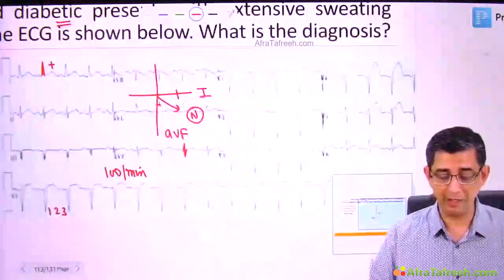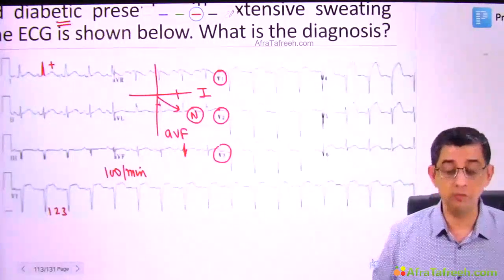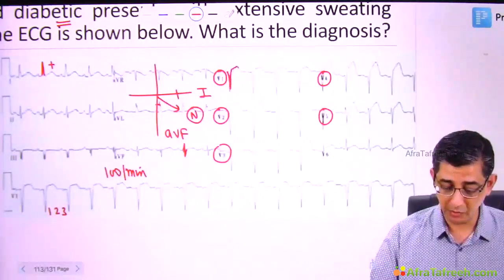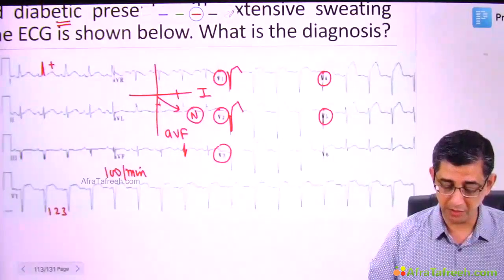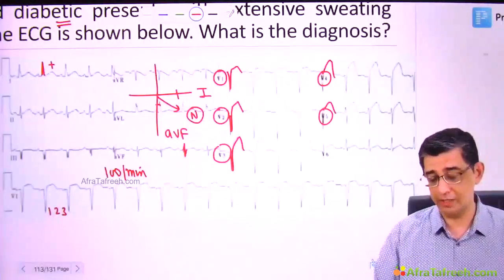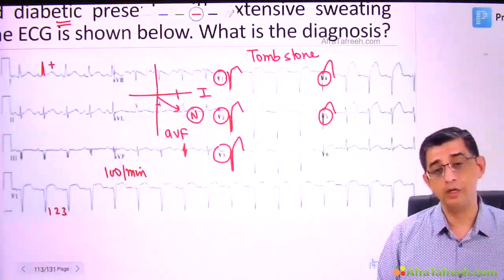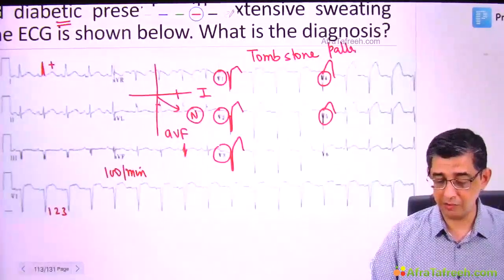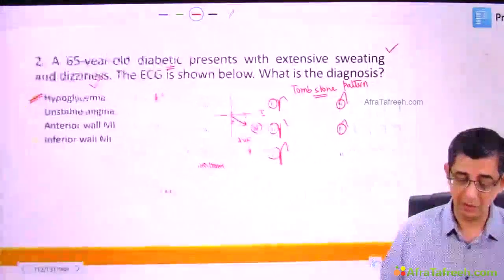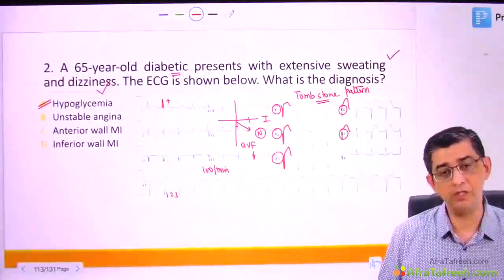However, as you move laterally towards leads V1, V2 and V3 and even going up to V5, there is a very substantial ST segment elevation present in the patient. You can notice this very peculiar ST elevation, and this is called a tombstone pattern. Tombstone pattern mainly highlights that this person is unfortunately not going to make it. It is a feature of ST elevation encountered in myocardial infarction. Since this involves V1 to V5, though ideally it should be up to V6 also, luckily some part of V6 might have been spared.